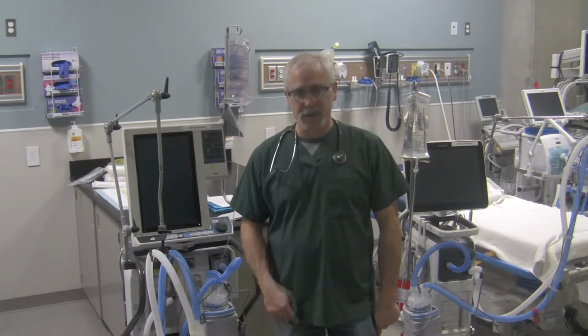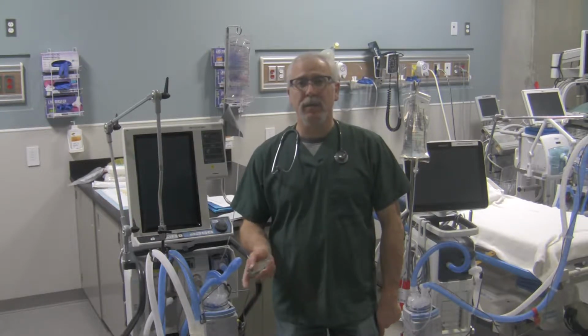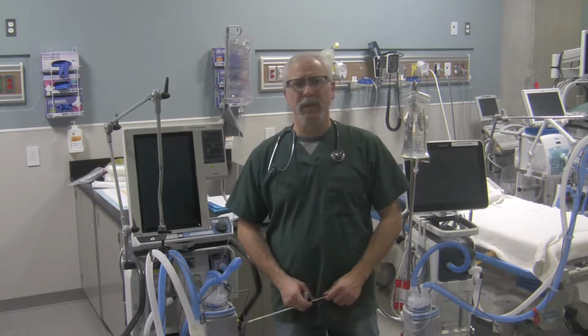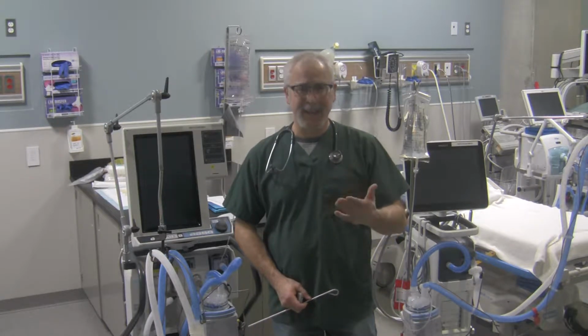What's a mechanical ventilator? Well, the textbook definition of a mechanical ventilator is a device that provides for the cyclic movement of air into and out of the patient's lungs. Now that's been a definition that's been around for quite a few decades already. I think Mushin coined it in the 1950s or 1960s because that's when ventilation really started to take off from a historical perspective.